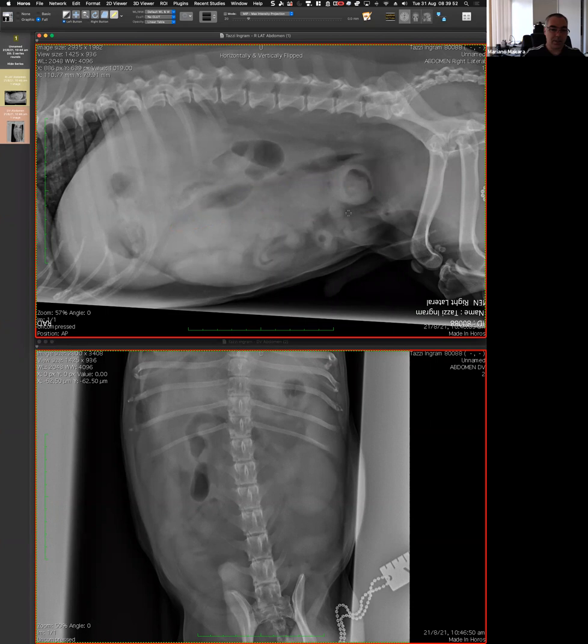Am I saying that that's easy? No, but that's the fun of radiology. It's trying to unfold, undo all the images, and then be aware of all the limitations and what could happen, which is also always coming back to the grapes. But the grapes are easy because we have an expectation about the grapes, what the shape of those grapes is. Now we don't know.